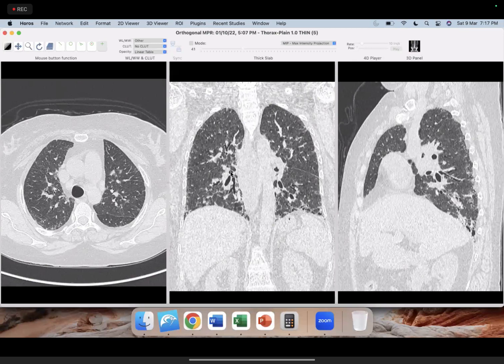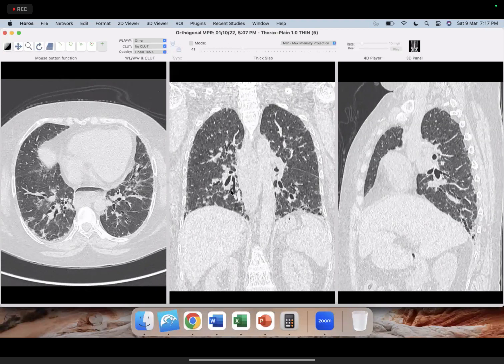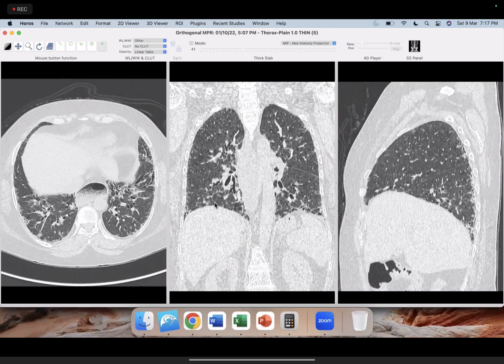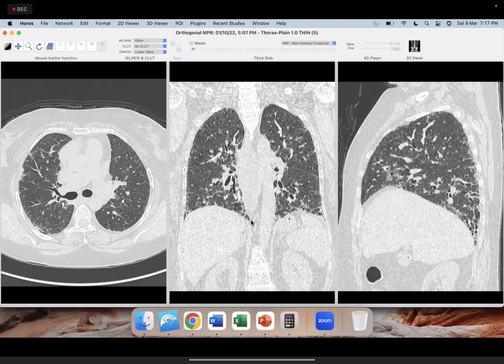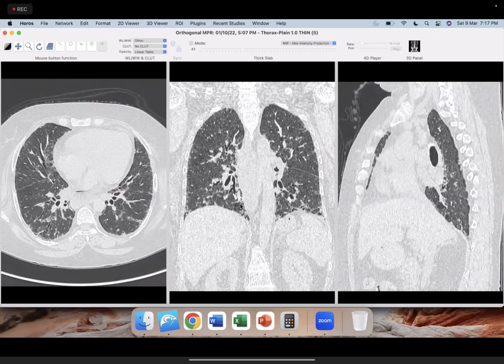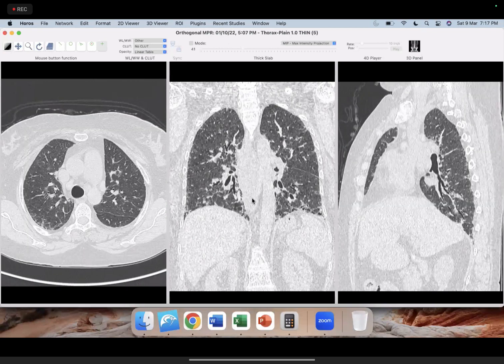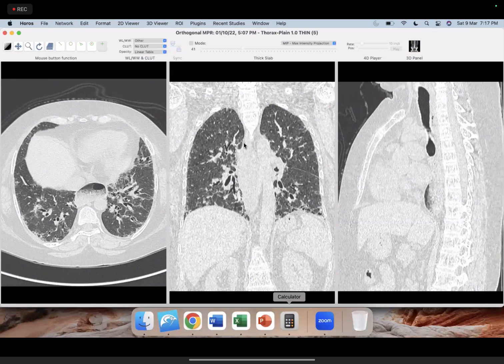Many a times you will see a spatial homogeneity also, where the upper lobes will also be equally involved. When you see such homogeneity and sometimes even subpleural sparing, which is not present in this case, this tells you this is an NSIP pattern, or a non-specific interstitial pneumonia pattern. This is not a UIP pattern because a number of factors of the definition are not fulfilled. And can anybody pinpoint this diagnosis? This can even come as a spotter in exam.